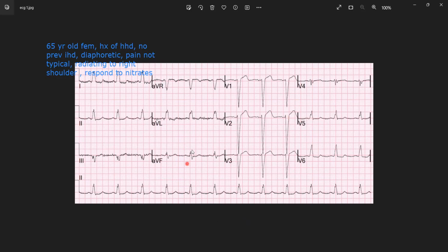But in the emergency department, of course, you don't have access to all of this. So in the emergency department, we look for concordance, which tells you, and I must be honest, when I've seen concordant ST elevation, so in other words, your QRS goes up and your ST is elevated, or your QRS is down, but your ST is also down, 99.9% of the time there is an ischemia going on over there. And it will tend to follow in the areas where you'd expect it to be. And if your patient has discordancy, it's quite a common finding. However, severe discordancy is more in keeping with an acute ischemic attack.